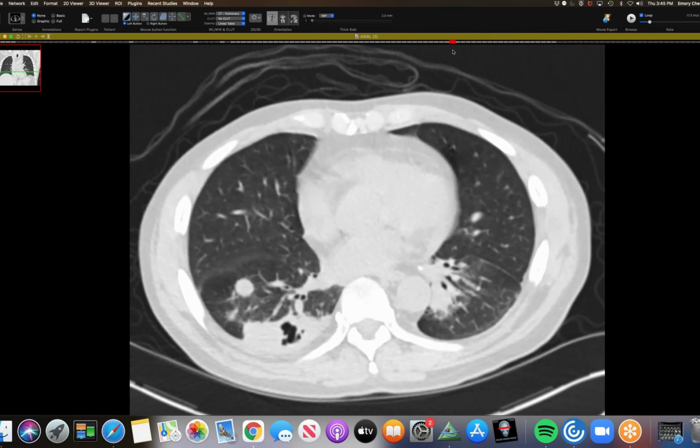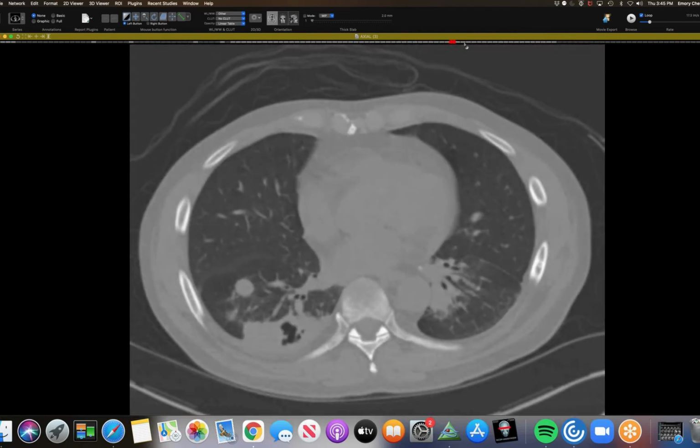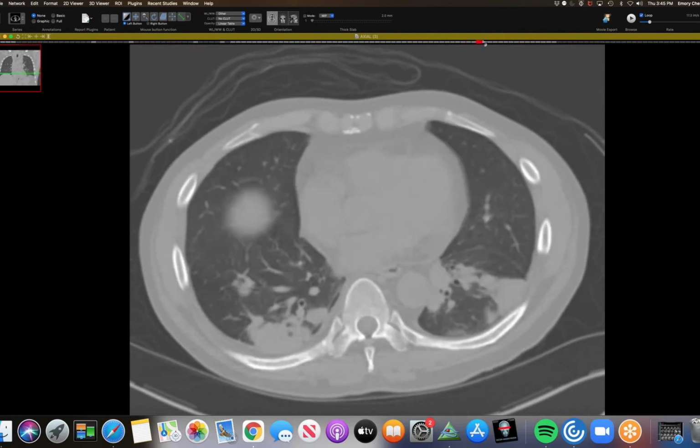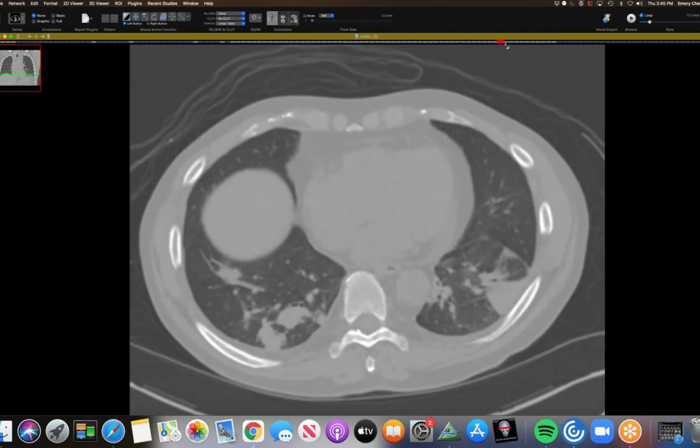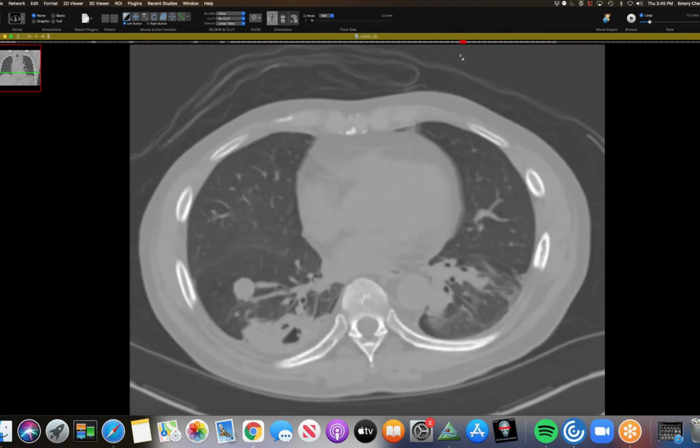I usually see large nodules and masses. It does occur in non-immunocompromised patients, but it's uncommon. But when I see big round nodules in an immunocompromised patient, like that one in the right lower lobe, crypto is high on my list. With other endemic fungi like histo, it's more miliary disease, or blasto can be big masses, and cocci the same way. Nocardia could look like this too, with big nodules and consolidation, but I've never seen it not have big nodules. It doesn't look like just ground glass, like pulmonary hemorrhage with angioinvasive disease. Yeah, I've not seen that.